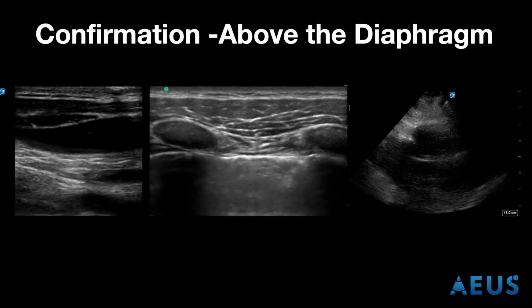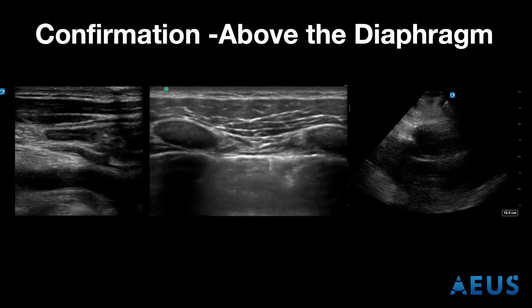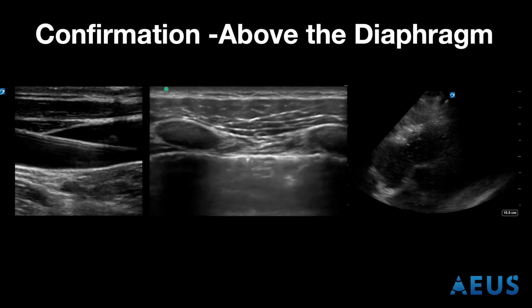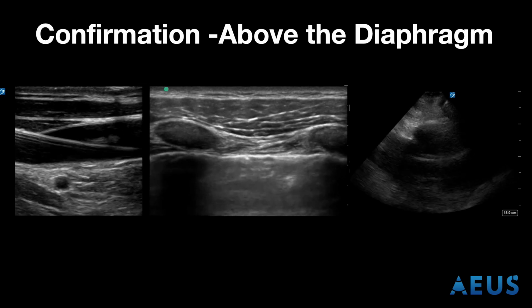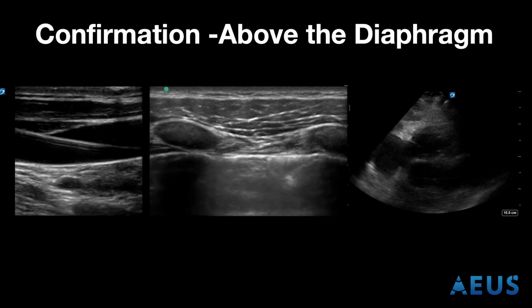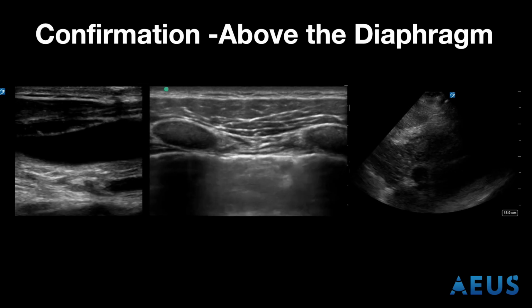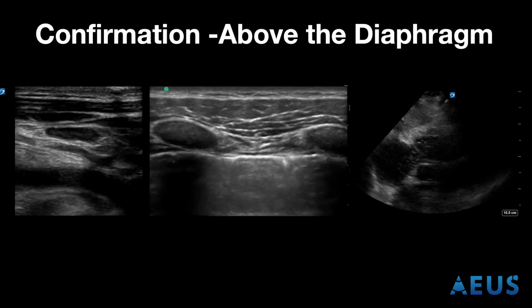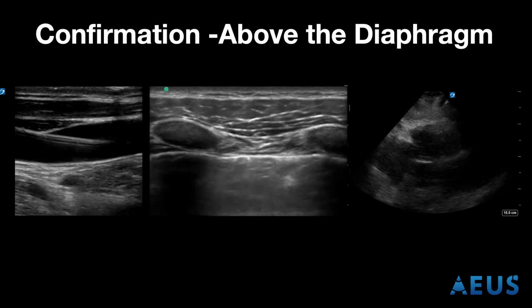This involves flushing your central port of your catheter with a small amount of saline and detecting the bubbles from that flush in the right atrium. A confirmatory rapid atrial swirl sign will have those bubbles appear within the right atrium in less than 2 seconds. A delay in bubble placement could indicate a catheter malposition, and an absence of bubble placement could indicate that your central catheter is either in an artery or a soft tissue.